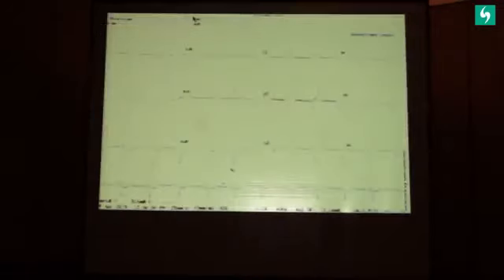Okay, this is good. I was thinking it may not come. This is a patient who is a classic example of how things really work. So in my unit, my juniors are very well trained, so they know what things are. So I was in a procedure in the lab. It was about 9:30, 10 o'clock in the morning, and my junior said that I'm shifting one patient. I said, what happened? He says that this is an IS officer. He went for a walk, had some chest heaviness. He's asymptomatic at the moment, but this is the ECG.